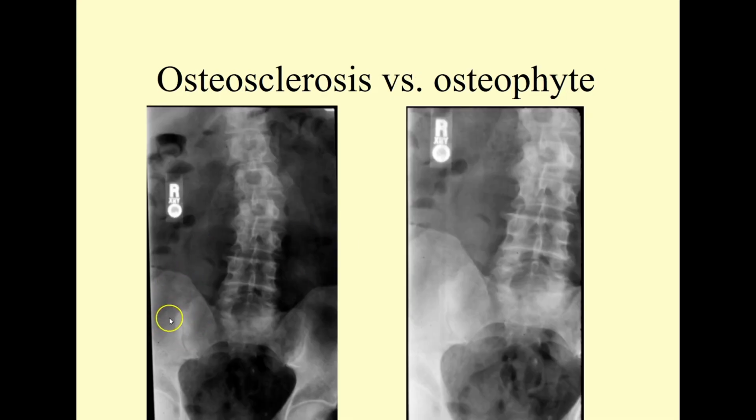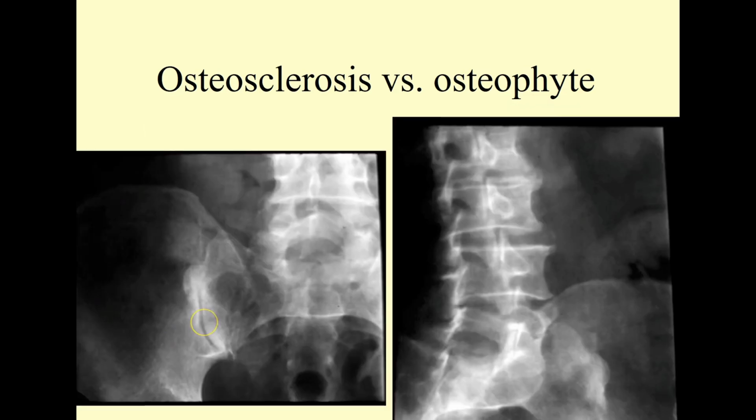There's a case that came across my view back many years ago. There had to be a student sitting reviewing films with me, and in class, we'd just gone over bone metastasis. So here we've got this dense region. It is by an SI joint, but as you know, it's kind of ear-shaped, auricular, at an angle. So I really can't tell in a single view whether we're dealing with an osteophyte or whether it's a dense bone region. So, of course, you lean in, you take a closer look, and we still can't decide, is this superposed or what? Well, fortunately, oblique views came, and that allowed us to see that this was a continuous cortex with the sacrum in this case. So now we were able to confidently identify this as an osteophyte, simple sacroiliac DJD, and didn't need to do anything other than report that.